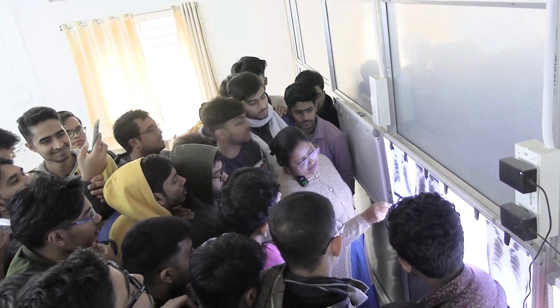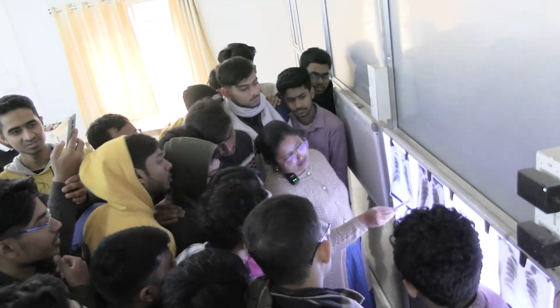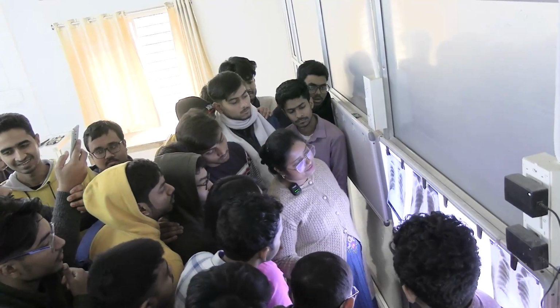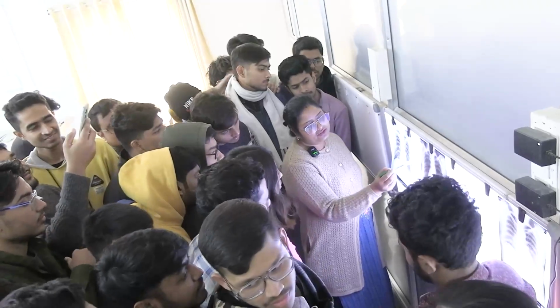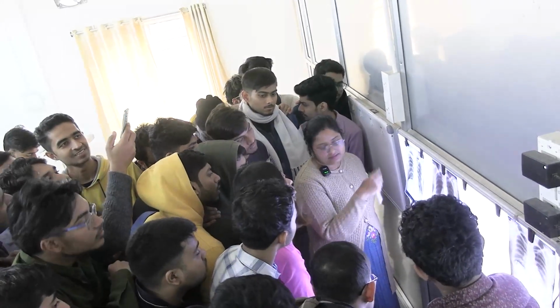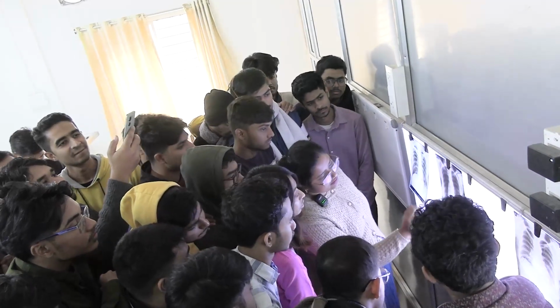This is the fundic gas shadow in the stomach. This angle is the costophrenic angle, and these two angles are the cardiophrenic angles. So this is complete, and these are the soft tissue shadows: skin, subcutaneous tissue, other tissues. In a female you can also see breast shadows, and here you can see the breast shadows.